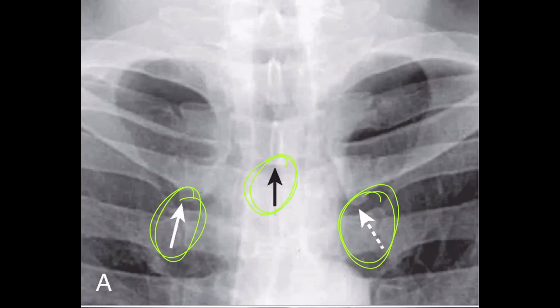That's a very important part. If the patient is extremely rotated and you see the airway going one way or the other, just make sure that the patient is not rotated. And the best way to test the rotation is to see the position of the medial ends of each clavicle relative to the spinous process of the thoracic spine.